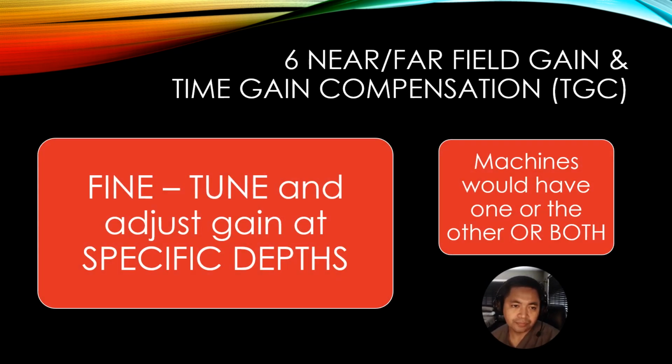Step 6, near or far field gain and time gain compensation. Now, these settings allow you to fine tune and adjust gain at specific depths of your ultrasound image. Now, most ultrasound machines would have one or the other or both.